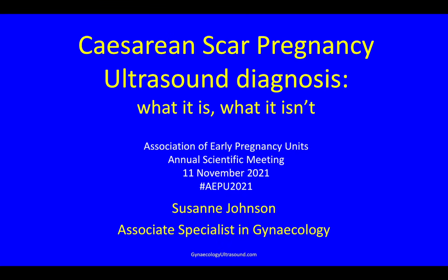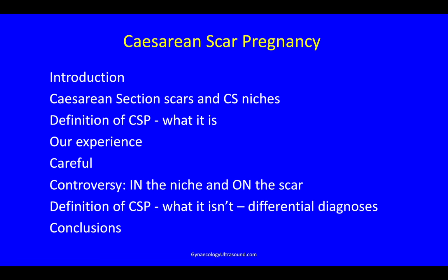This is a presentation on the ultrasound diagnosis of Caesarean scar pregnancy. I'll be talking about section scars and niches, the definition of a scar pregnancy, some controversy, and differential diagnoses.